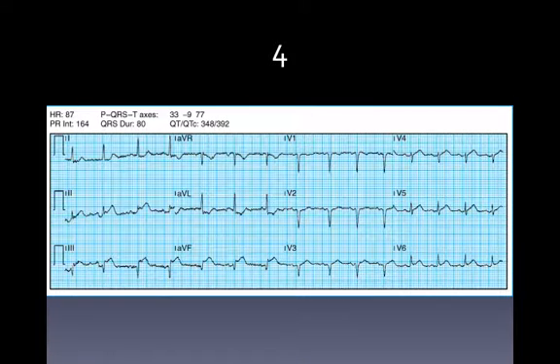Practice number 4. Elevation, elevation, depression, elevation. We should watch this section. Looks like they're fixing to elevate. They're not quite a millimeter yet. However, can I already confirm an MI? And the answer is yes.